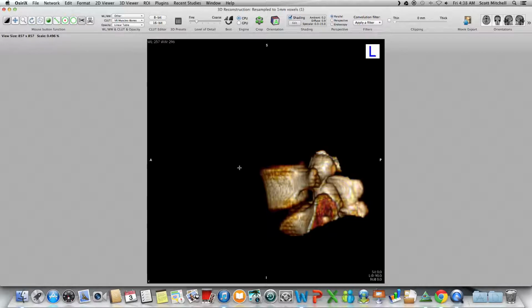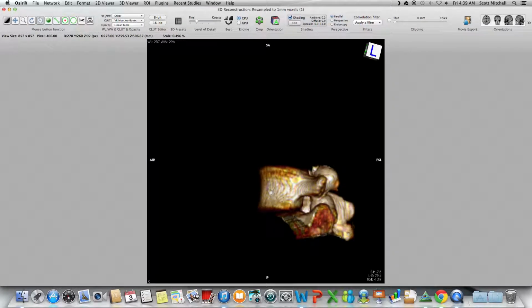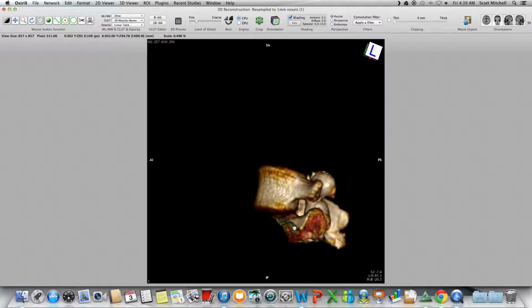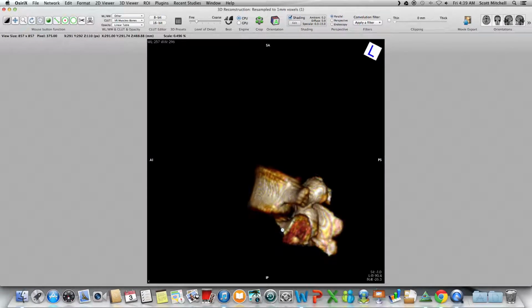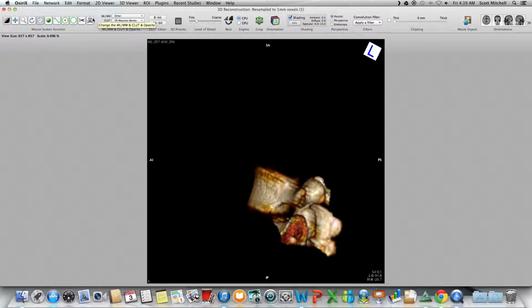Alright, let's cut this guy right here. Just keep on getting closer and closer to what we want. Don't worry about these islands, we'll fix them up at the end. So I think what I'm going to do is cut right. Make sure I don't get any of the body, but that looks pretty good. I'm going to leave maybe a little conservative right here. Just taking bites.